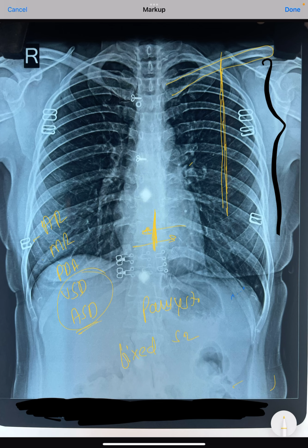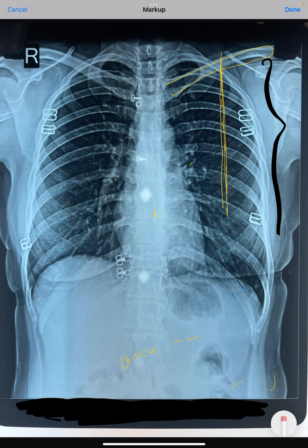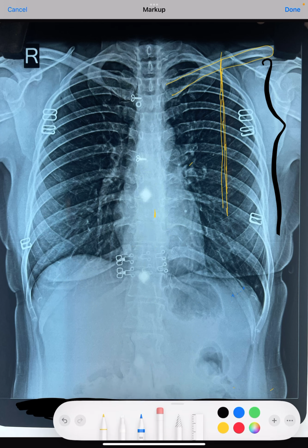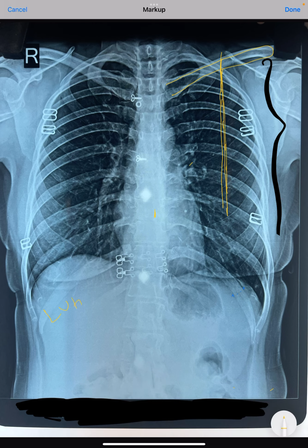So these are very typical features of the regurgitant or volume overload conditions, which can shift the apex to the lateral side. If there is LVH from a pressure overload, for example in hypertension, there is no fluid overload, only pressure overload. There is high pressure against which the heart has to pump.